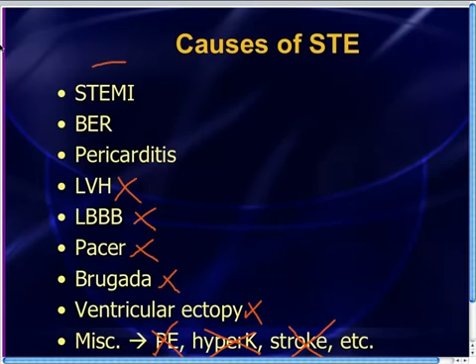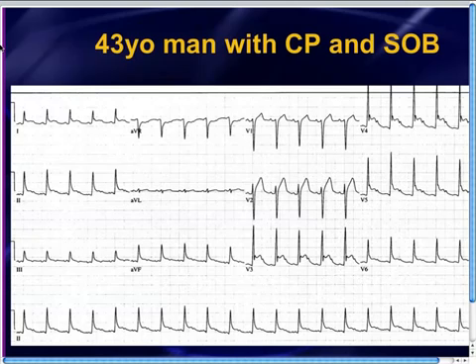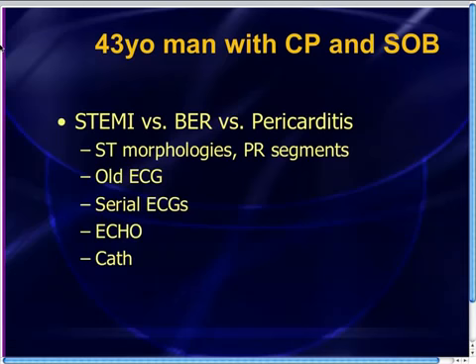So essentially what we've got is a very common quandary. Is this ST elevation MI? Is this benign early repolarization? Or is this pericarditis? All right. So when you're trying to figure those things out, there's some simple techniques that you can do.